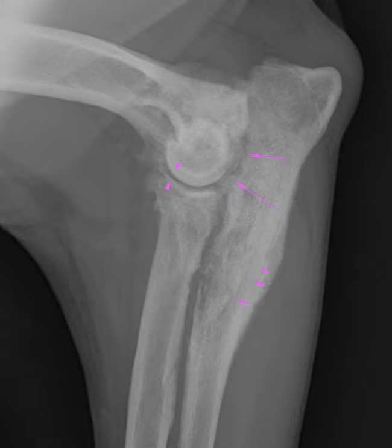So for me, this is an aggressive lesion because I've confirmed that there's bone lysis. I believe there's an irregular periosteal reaction. The zone of transition, I think we could agree, is fairly mid-length, I would say. It's difficult to distinguish when the abnormal bone ends and the normal bone begins. And my last criteria, rate of change, is something that we would assess if we had multiple views. Once we're confident that we're dealing with an aggressive lesion, I then like to categorize it as affecting one bone or multiple bones. That's actually quite difficult in this case because we're unsure whether there's involvement of the adjacent humerus and the adjacent radius. Why am I unsure?